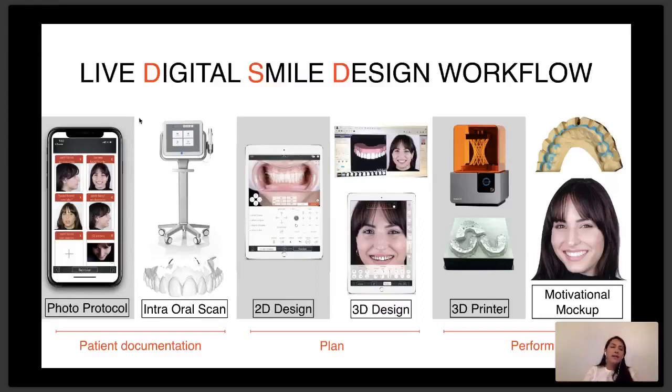So here is the digital smile design workflow that we would like you to start to integrate into your practices. The first step is going to be digitalizing your patient by taking the photos, doing the intraoral scan, transferring that intraoral scan into the app, and making all digital patient documentation.